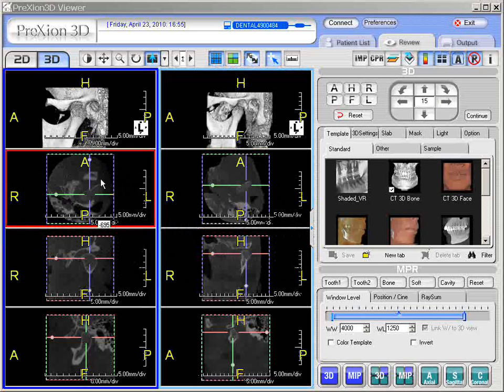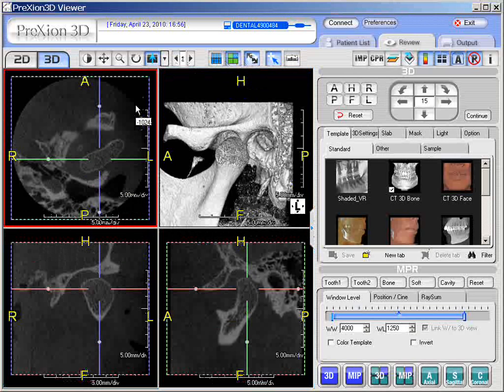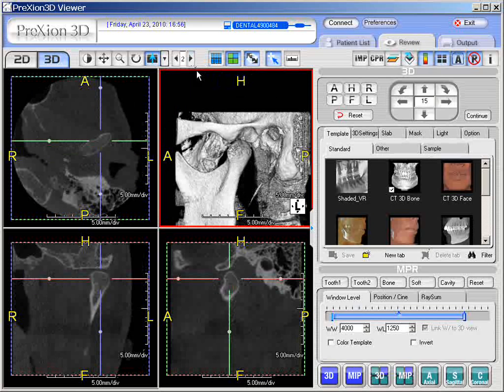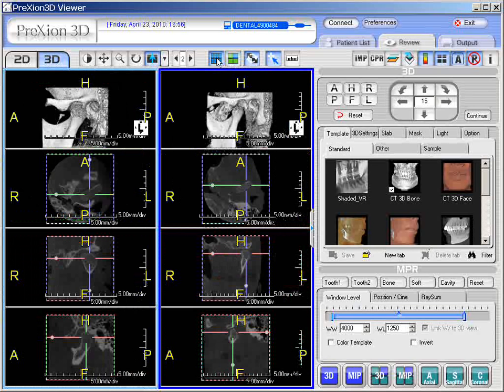One has the ability to simply load up one study as you would normally see it. To do that, you can simply come to this icon that says Display One Series. If we click it, we've got the Display One, which is the closed portion of the TMJ. So we're looking at the TMJ in the closed position. We can simply click the next arrow over for the opened, and we have now the open position for the TMJ, axial, coronal, and sagittal. To go back to the multi-series or display all series, click this icon, and you'll get back to the side-by-side format that we originally started with.